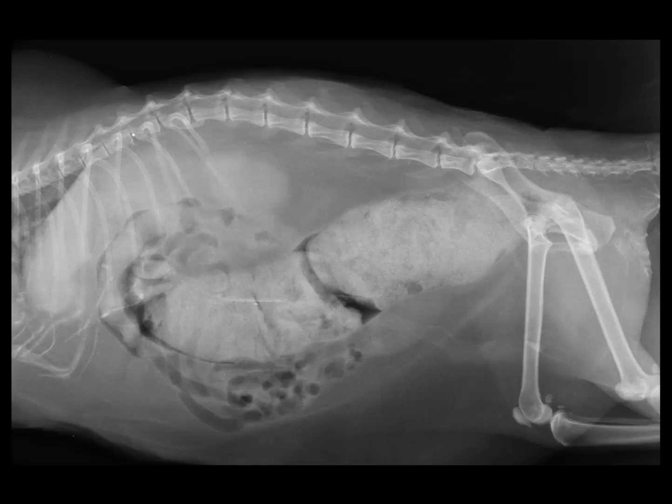Here we have a cat who's unsuccessfully straining to defecate, and I think it becomes fairly obvious what the issue is here, at least at some level, maybe not the underlying disease, but there's a lot of fecal material in this colon. It is massively distended with very dense fecal material. This fecal material is basically mineral opacity, so it's very desiccated. The cat is constipated, and one could say obstipated because it's much larger. The cat is going to have a megacolon. If you measure that versus whatever vertebral body you want, that's going to be enlarged.